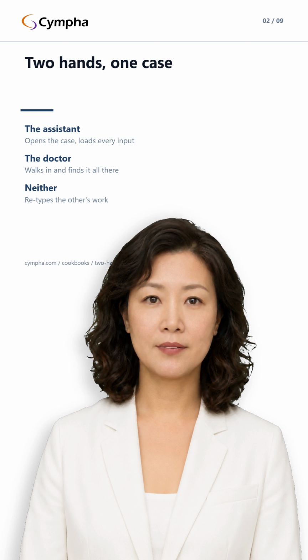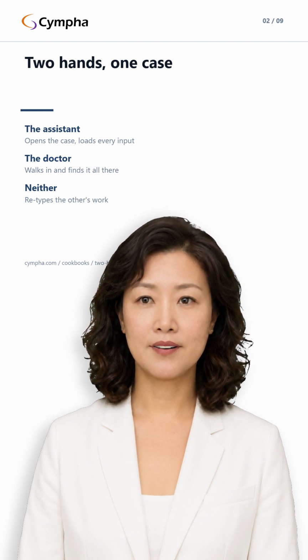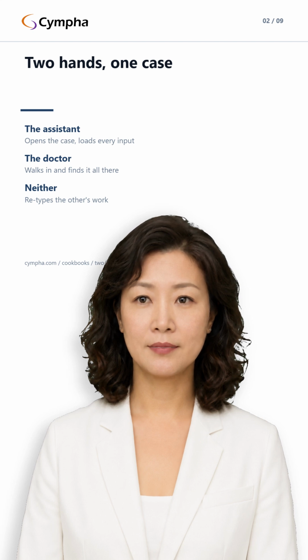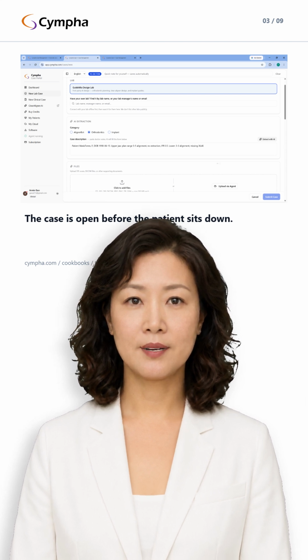Cympha is built around the division you already have. Your assistant owns the inputs, the demographics, the photos, the scans. The doctor owns the thinking, the exam, the diagnosis, the plan. Each person works on the part they actually own, and nobody retypes the other's work. The patient is never asked the same question twice.